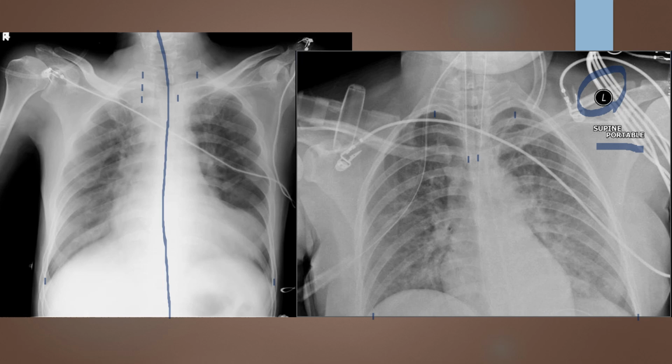So now I have to evaluate the patient. The first thing I'm going to look at is my mid-coronal rotation, and you can see here's an SC joint to vertebra distance. Here is our other SC joint, so we see that they are not equidistant to the vertebra. Again, the right side SC joint is away from the vertebra, indicating that the patient, again, was in an RPO position. So we know that we have some mid-coronal rotation. I can also track a little bit better on this one those spinous processes. They do look relatively centered, but my SC joint evaluation is going to be a little bit more sensitive.